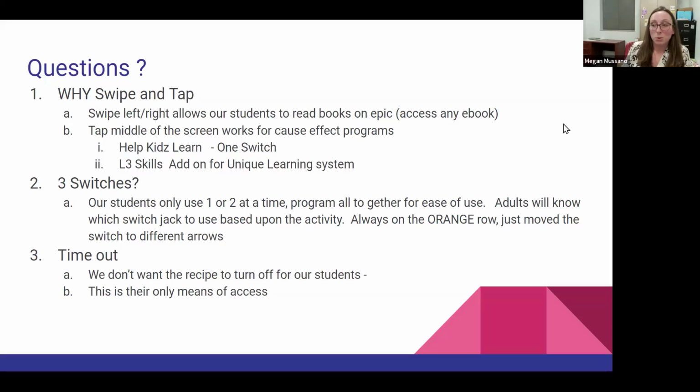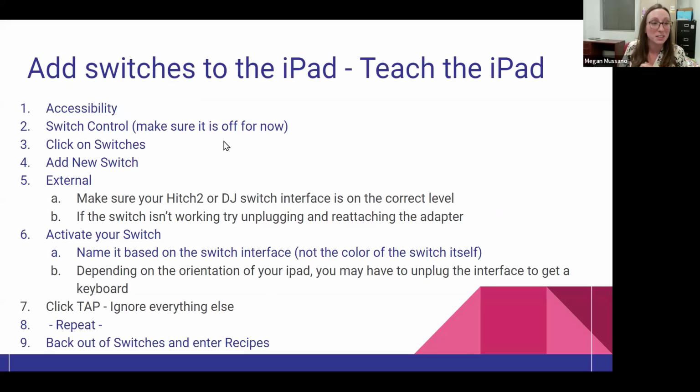Okay, I'm going to keep doing more because that was kind of my iPad basic switch interaction. I actually went a little crazy above and beyond and did some crazy stuff. So let me show you a few more videos just to hopefully blow your mind. Sorry, I keep saying that, it's not very speech therapist of me. So hard to do blank faces.